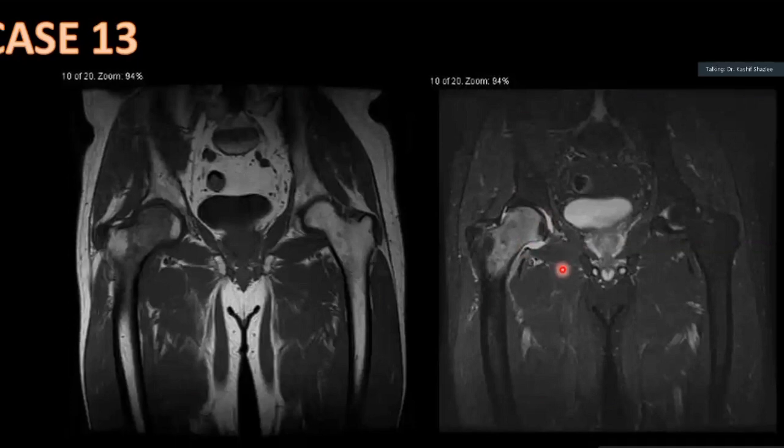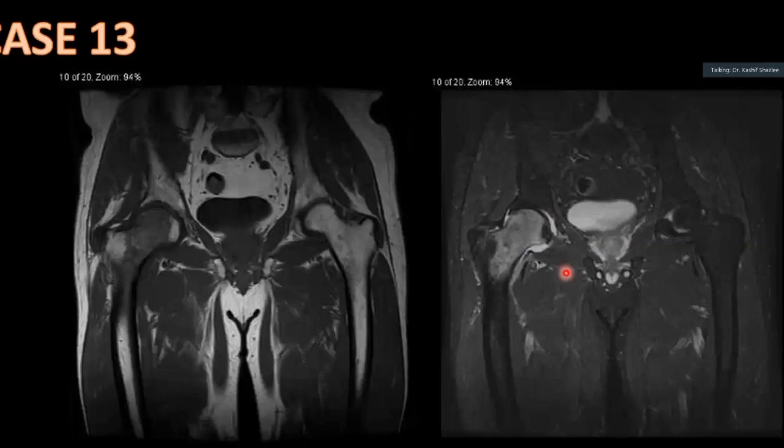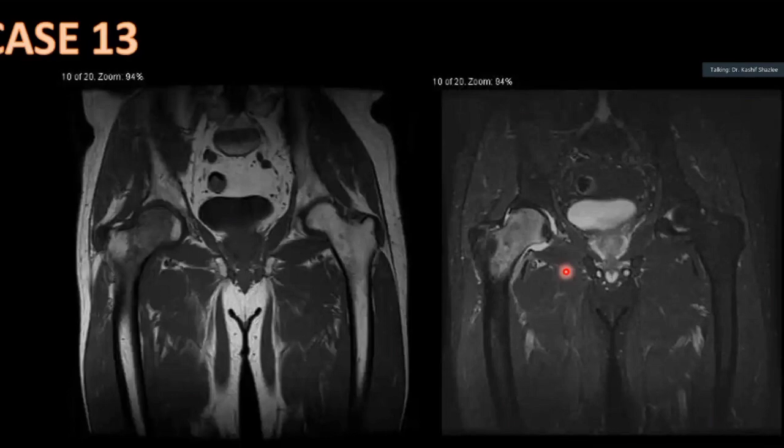So that is transient osteoporosis of the hip joint. Transient osteoporosis of the hip joint. Then most of the time it's self-limiting. Okay. So hyperintensity in subarticular location doesn't always mean that there is avascular necrosis. Many times it's transient osteoporosis of the hip joint. Okay.